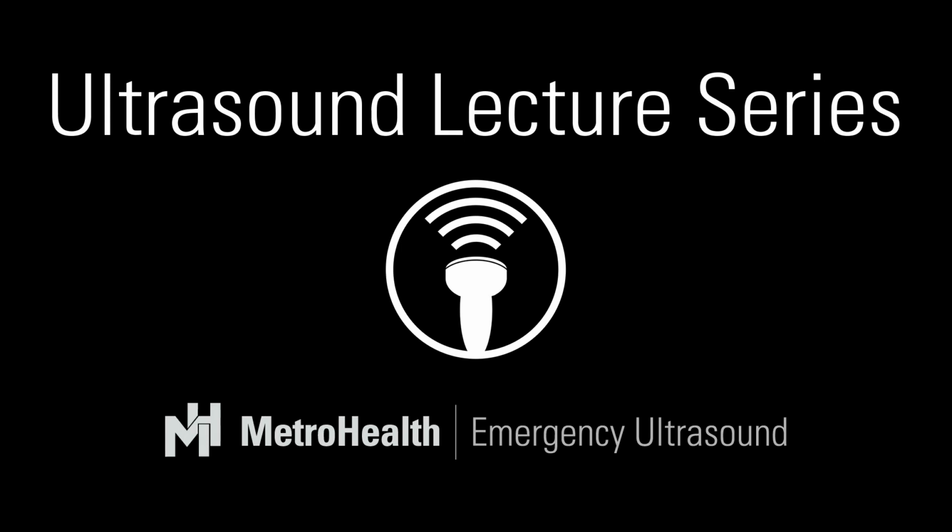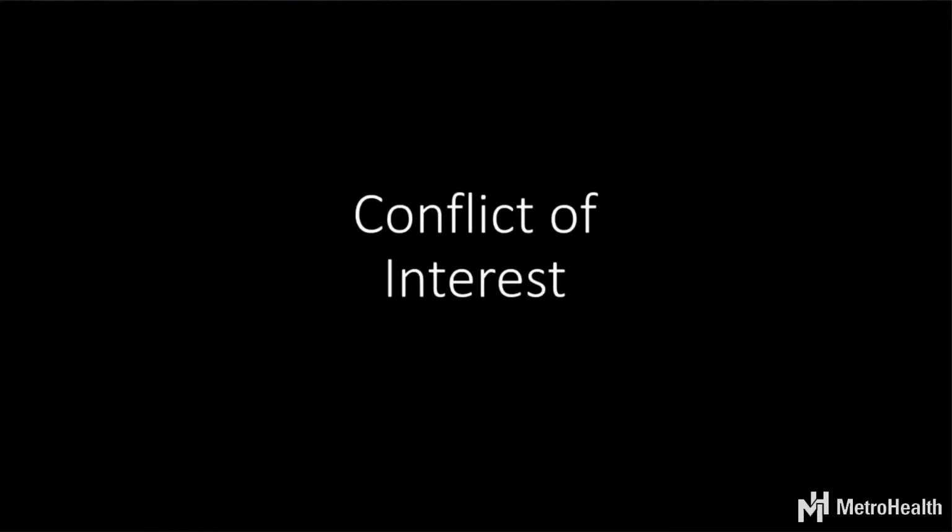The topic is about spleen and liver, and those things you find while you're scanning and doing your FAST exam. You see the liver looks like Swiss cheese, or there's something funky in the spleen, or little knobby things in the liver. This is a series of cases I've had over the years, and we'll talk about what's normal and what's not normal, and develop limited differentials for those abnormal things that you find.